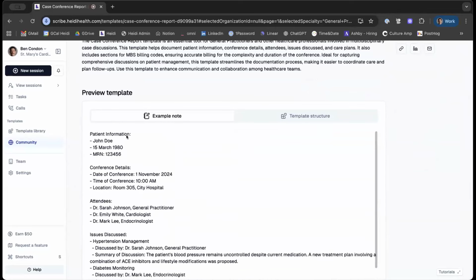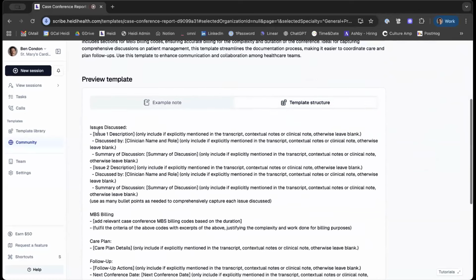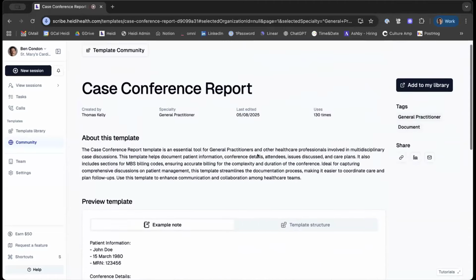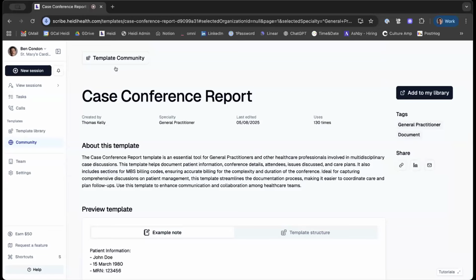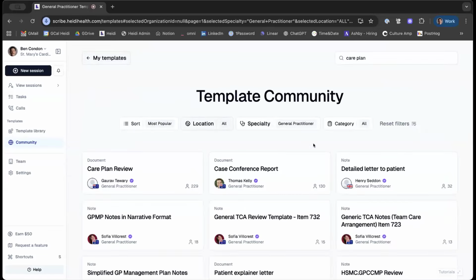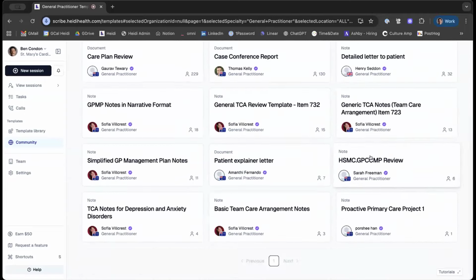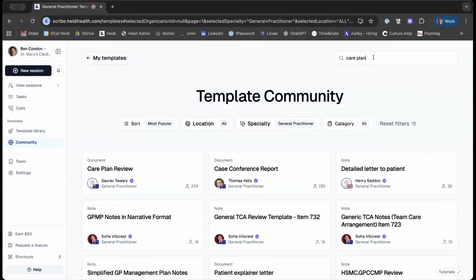Or if I really like just the first section but not the rest, I can go into the template, copy the section that I like, and add that into a Word document and create my own template that will use a number of different features of templates. So as a starting point to understand what's capable, definitely have a look at that.